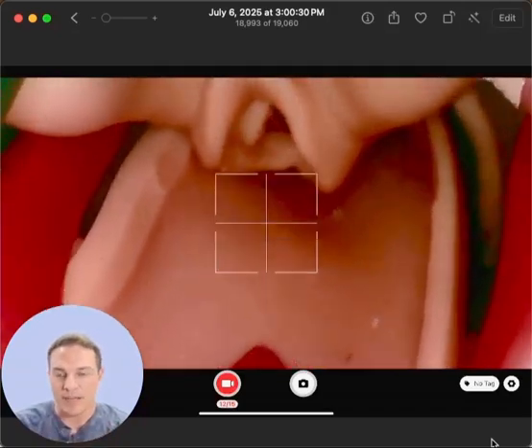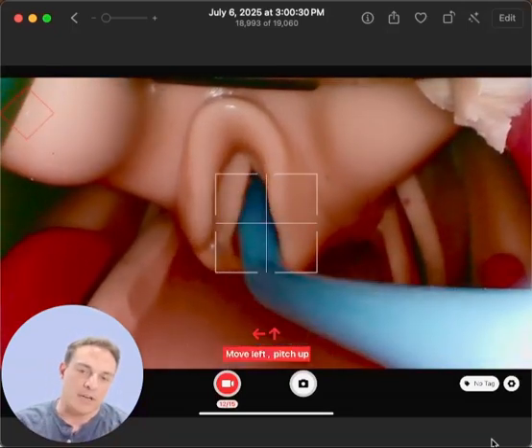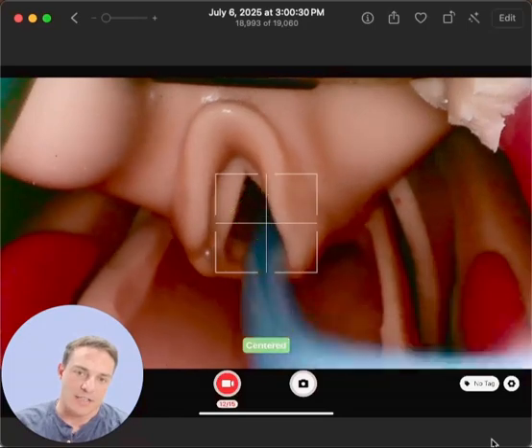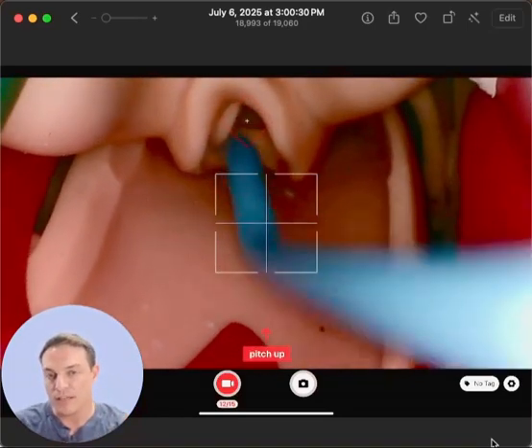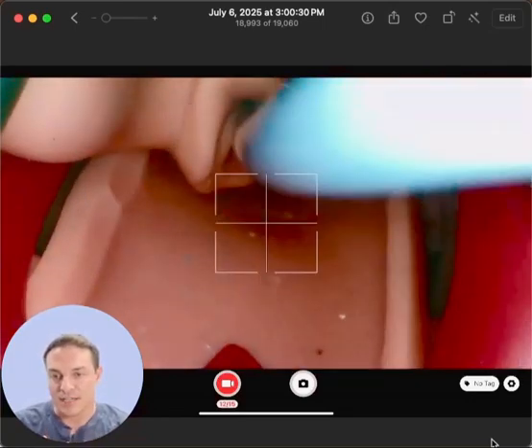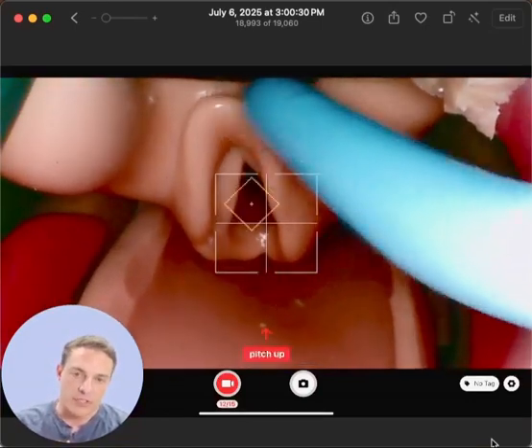Here, you see some color-coded things, yellows, greens, reds, those sorts of things, showing the learner where you should be in relation to that glottic opening for the highest predictor of success. Now, this is again V1, more of a thing that we're showing in real time.